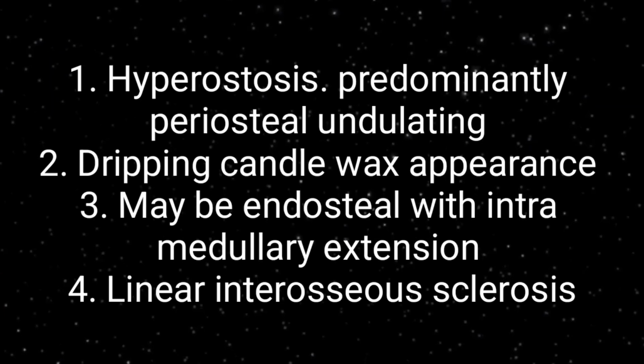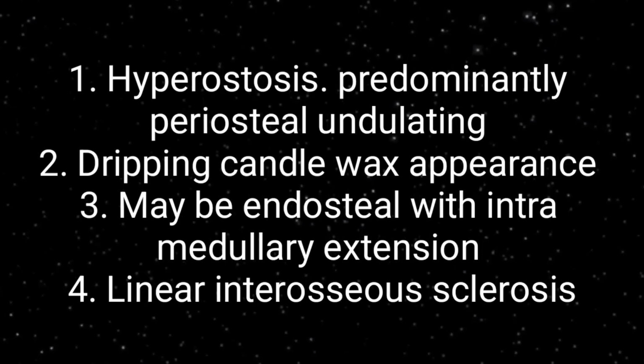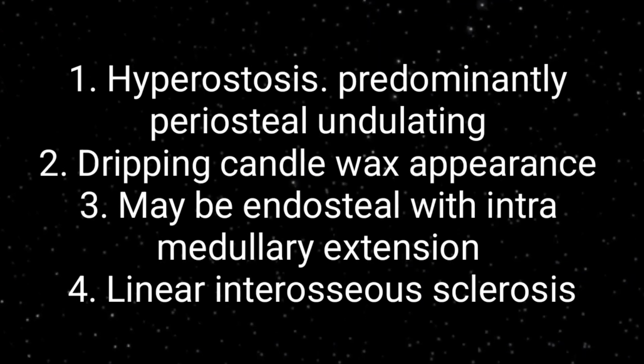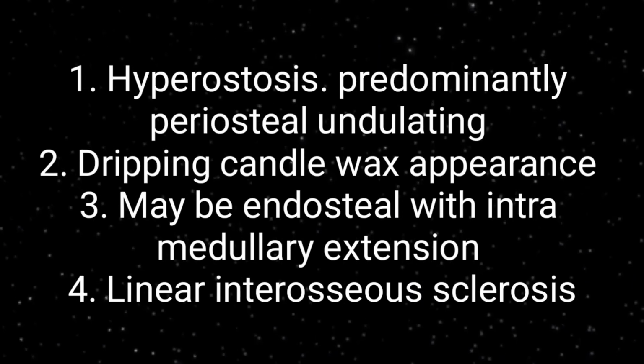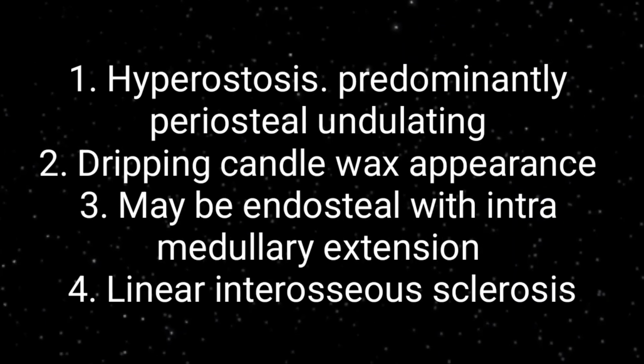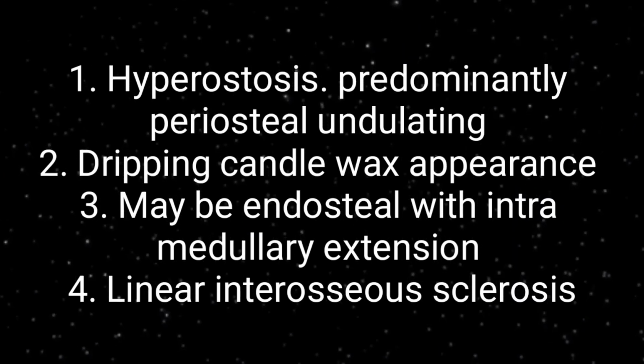It may be endosteal, or it may extend into the intramedullary region as well, and sometimes it may appear as a linear interosseous sclerosis.